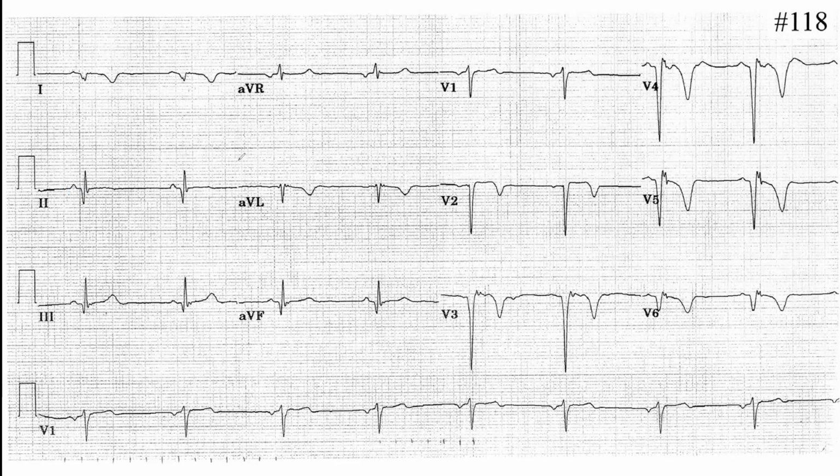Now list me, where can you see pathological Q wave? Lead 2. Okay, for 2, for sure, yes. aVF and aVF and 3, okay? We do see 2, 3, aVF, okay? Do you see any ST changes in these leads? No, there is no ST elevation. So it means that we do have an inferior definitive or old MI. Okay, so that's an old MI. Only the necrosis stays here. All right, this is one.